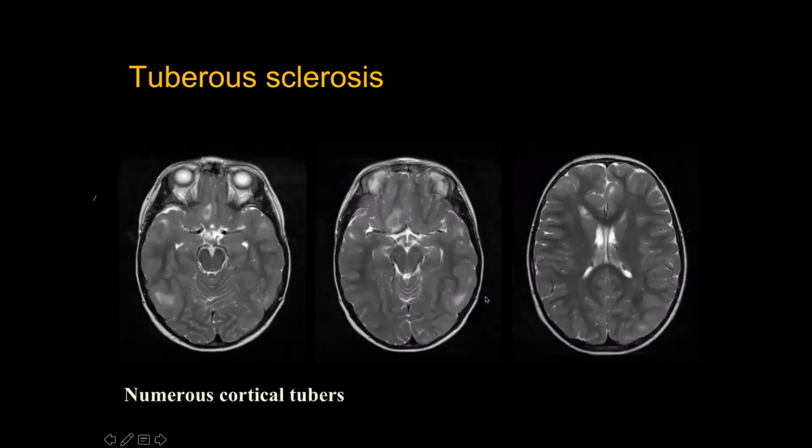So, syndromic. You have multiple lesions. If you see multiple lesions and it looks really bizarre, you've got to think, is this syndromic? Then you've got to tie all this together and see whether you can come up with a diagnosis. If you remember the common syndromes like NF1, NF2, TS, and VHL, those are the first ones you want to exclude.